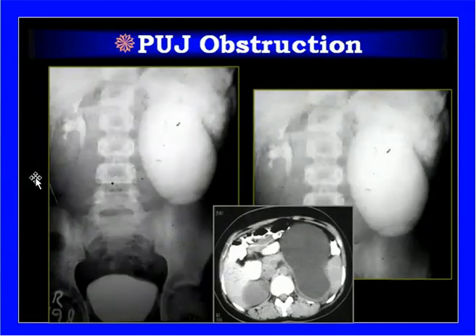Now, after birth, when there is a suspicion of pelvic obstruction, the contrast study of the patient is performed, and you can see grossly dilated extrarenal pelvis on the left side with dilated pelvic system, no ureteric outline on the left side. On the right side, the system is normal and you can see the proximal ureteric outline. The same patient, axial image taken at the renal level, you can see grossly dilated extrarenal pelvis with PUJ obstruction.